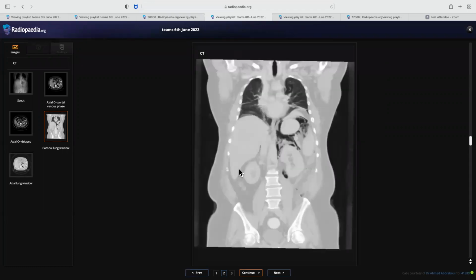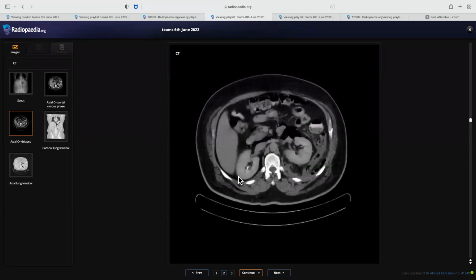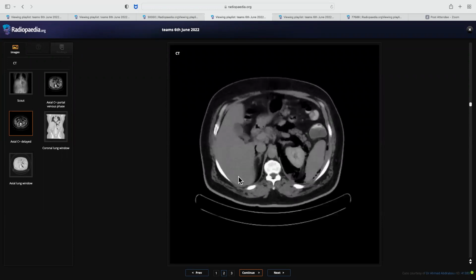The patient presents with fever and fatigability, so I would look for the cause of this retroperitoneal air. It's not an emphysematous pyelonephritis because the kidneys appear normal.